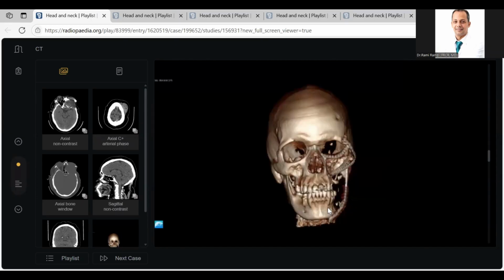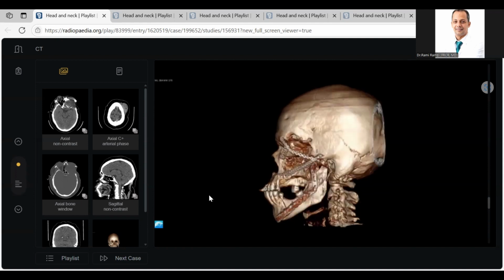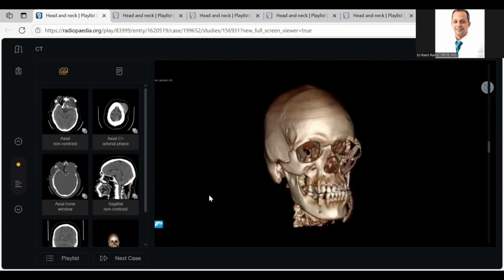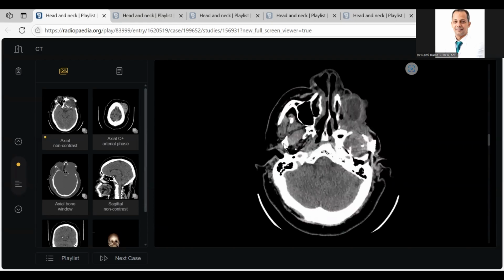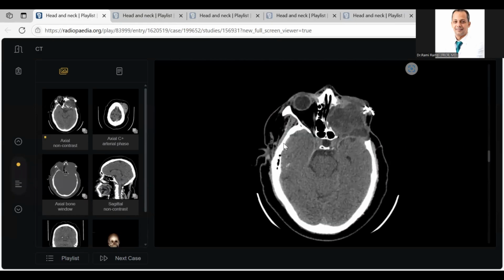This patient has at least, we should tell, status post left hemimandibulectomy, left zygomatic resection, maxillary resection, and left eye or orbital exenteration, because there is no eyeball here. There was some malignancy or aggressive lesion, and they made all this reconstruction. This is prosthesis, not calcification.